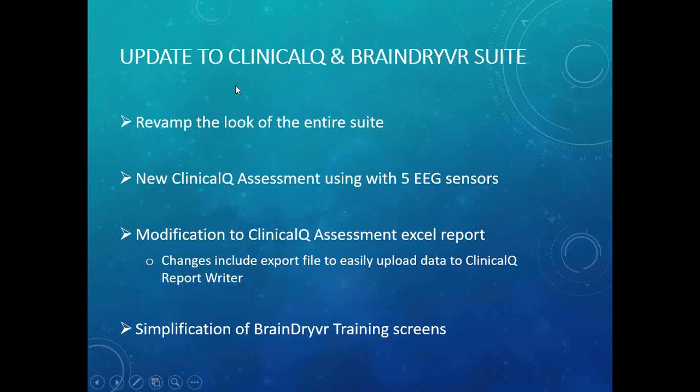One big thing is that we've revamped the look of the entire software suite. If you are used to using the old version of the software, you know it's very black, lots of black, and I decided to change that. I want it to look good. One of the funny things is that when you use software with any client, if it looks good, they believe in it more. It doesn't even matter what statistics or what method you're using. If it looks nice, they believe it more. And so that was one thing I wanted to change. On a second side, I just wanted to make it look better because I could, and because I wanted to improve how it ran. So that was one big thing we did change.